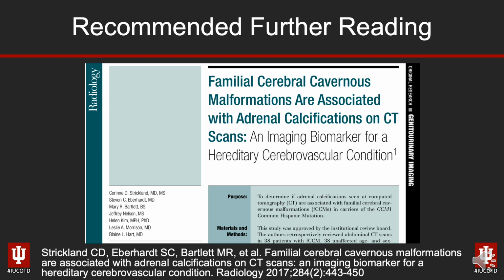So there was an interesting paper that was actually brought to my attention via Twitter, via Mark Mamlouk, and this was published back in 2017, so not too old, in Radiology. But this was looking at patients who had cerebral cavernous malformations, and if you take a look at their adrenal glands and you see areas of punctate calcification, that's an imaging biomarker that suggests that you're dealing with hereditary cerebral cavernous malformations. Those almost certainly represent vascular malformations with phleboliths within the adrenal glands.